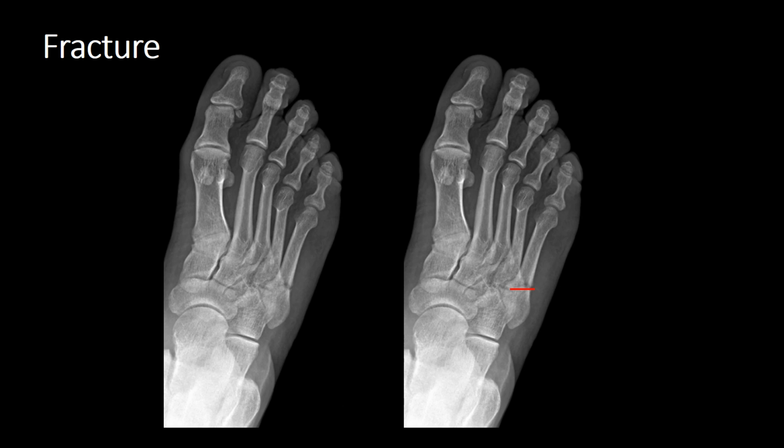So how can we tell the difference? Well, a Jones fracture is a transverse fracture that is distal to the styloid process of the fifth metatarsal. So essentially, it's distal to the metaphysis. And so therefore it's important to recognise this fracture and to describe it as such, so that it's very clear that you haven't misconstrued it from a base of fifth fracture.